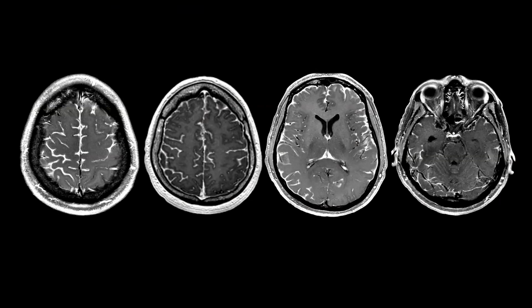All right, Kristen Huntoon says breast, leptomeningeal disease. Okay, interesting going straight to breast. Breast does do this, absolutely. I've got from Octavio, meningitis, sarcoid, lymphoma. All of those are good. Subarachnoid. Okay, the point is, Andrea Gilbert, pachymeningitis. The problem with, listen, Dr. Gilbert, the problem with pachy is the dura. Pachymeningitis is meningitis confined to the dura. Do you see how the process is going into the sulci? And the dura doesn't go in the sulci, right? It bridges. The arachnoid goes to subarachnoid space, okay? Is that cool? Although I like that.